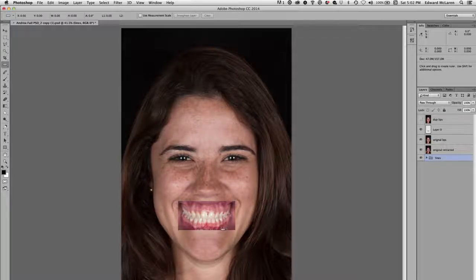We're going to work on this image right here, and then show the patient what it looks like with old and new teeth. And hopefully, the whole point of all this is to motivate them to go to the next level. Now, realize that this is just a digital smile design. This doesn't tell us anything about function and biology, and we're going to need to think about all of those things. But it should really be thought of as a motivational tool.